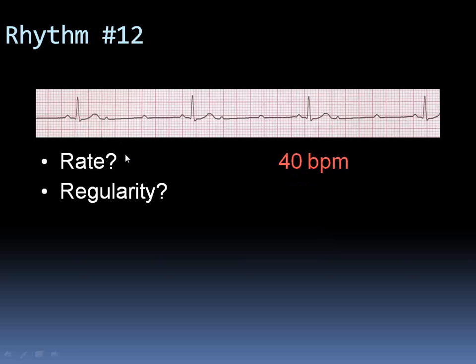And every 1 out of 2 or 1 out of 3 impulses being conducted is a dangerous rhythm. This is consistent with type 2 second degree AV block because the PR never lengthens, the PR always stays the same. And a lot of P waves are not conducted. It is not like you have 2 conducted and a dropped P wave. Only 33% or 1 in 3 P waves are conducted down to the ventricle.